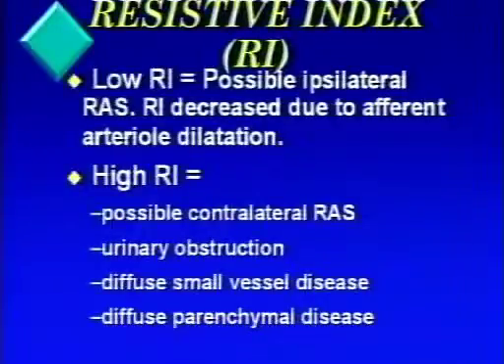It has fewer pitfalls in terms of having to work around bowel gas and angle of incidence issues. And so if you can start out with that and get pretty good results, seeing that your results are very symmetrical from side to side, then you can be pretty confident that you're getting accurate results. Where you'd want to move on to the direct method would be if you're having a difference from ipsilateral kidney to contralateral kidney.